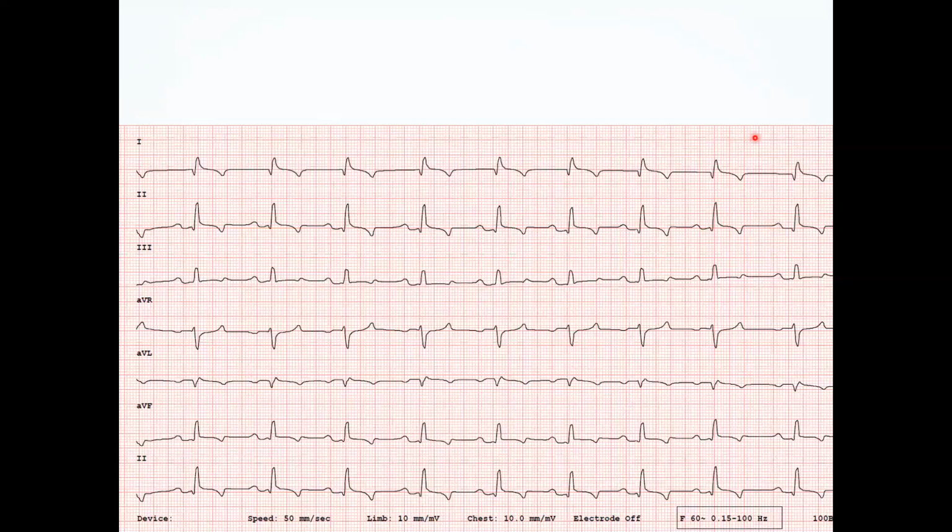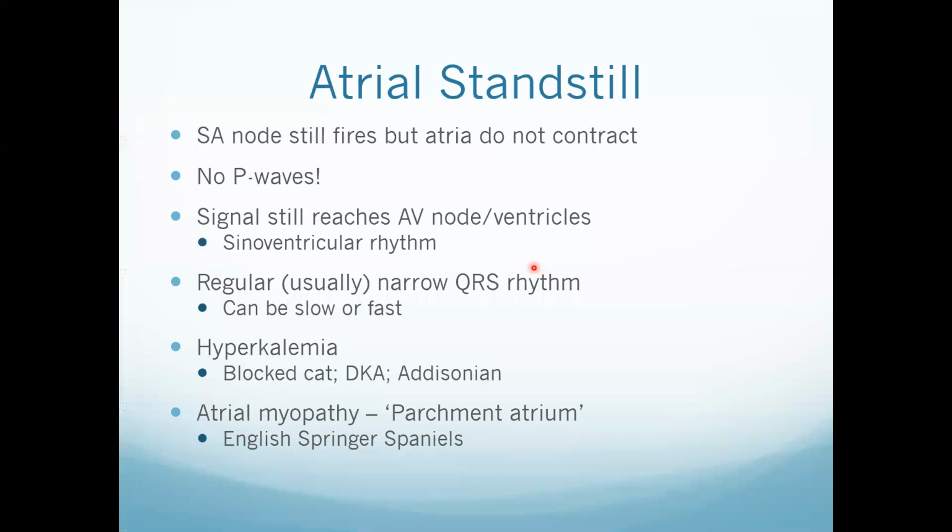Okay? So you can get a really rapid response in these patients, and also the overall heart rate has increased because the sinus node gets slower and slower the higher the hyperkalemia gets. So once you correct it, the rate is going to get a bit quicker as well.